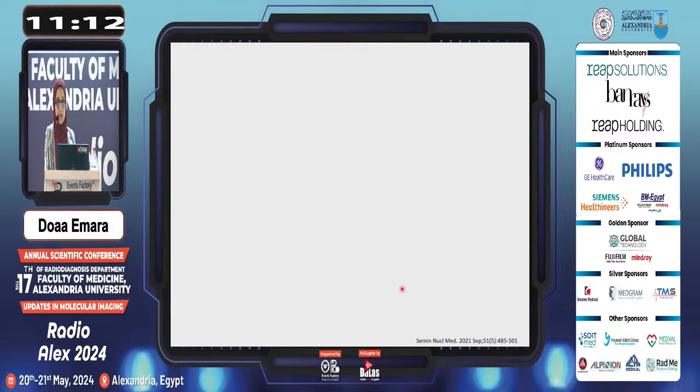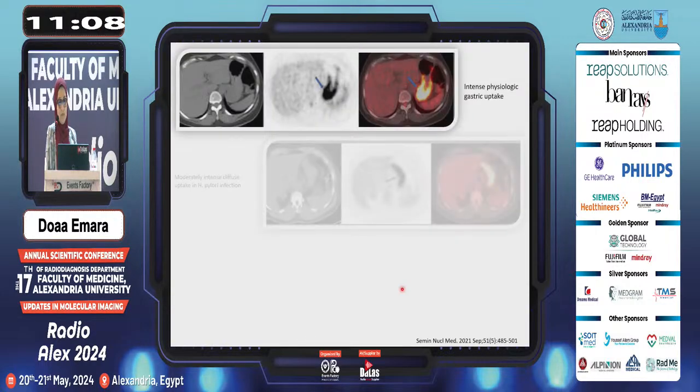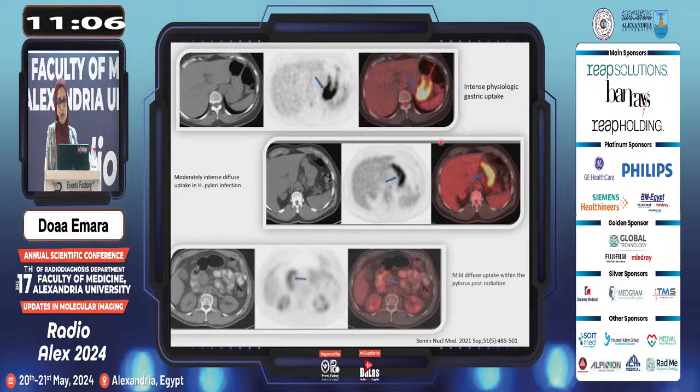And now I'll go through some neoplastic and non-neoplastic lesions. These are gastric uptake in different patients. The first one is physiological uptake.